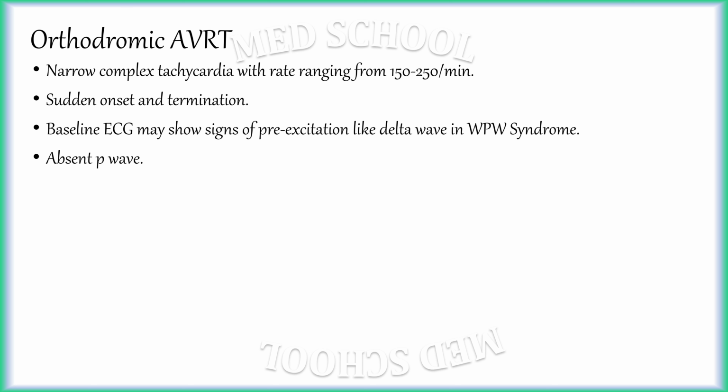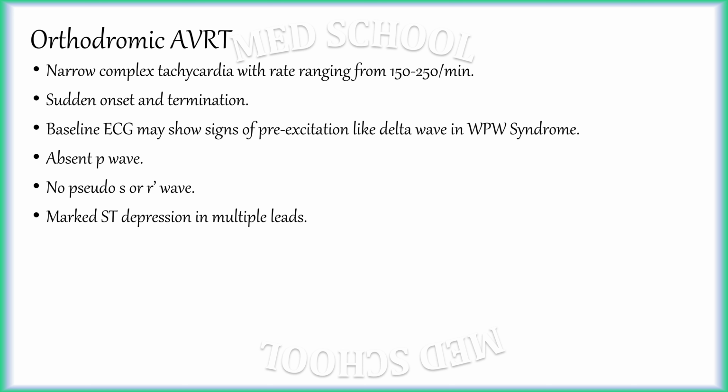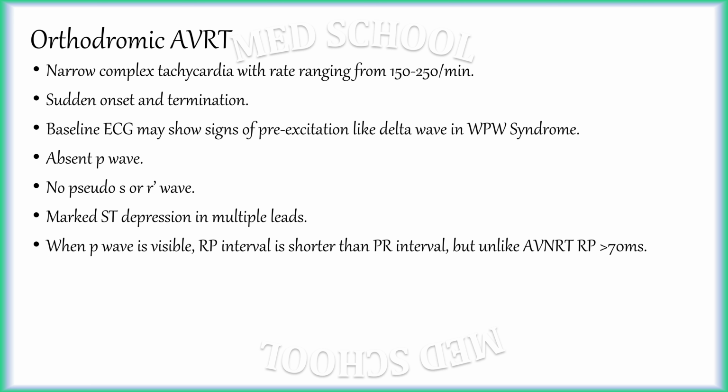There are absent P waves. There are no pseudo S or R' wave. There is marked ST depression in multiple leads. When P wave is visible, RP interval is shorter than PR interval. But unlike AVNRT, RP interval is more than 70 milliseconds.